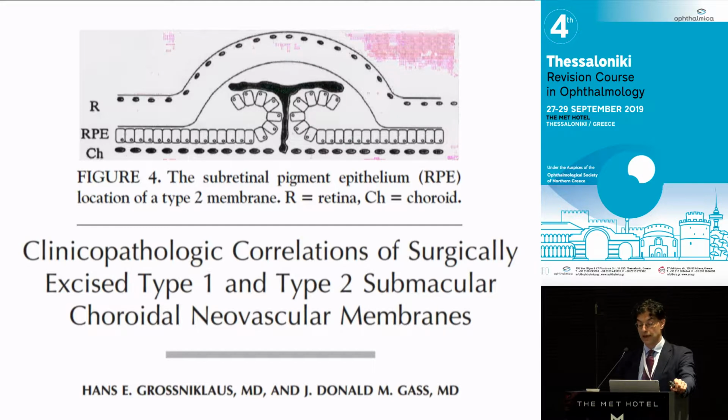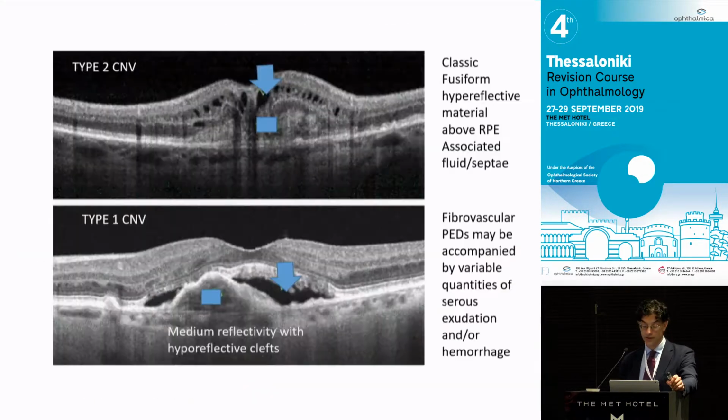So if you can imagine a lacquer crack in a myopic patient, a focal weak point, and there's some tipping point where blood vessels grow and leak and bleed in the subretinal space. Now, in a young patient with healthy RPE, the RPE can still proliferate and enlarge and grow around it. So you think of a myopic membrane, with time it often pigments, and that's actually a good sign. And you'll get certain characteristic features when you've got a good treated endpoint.